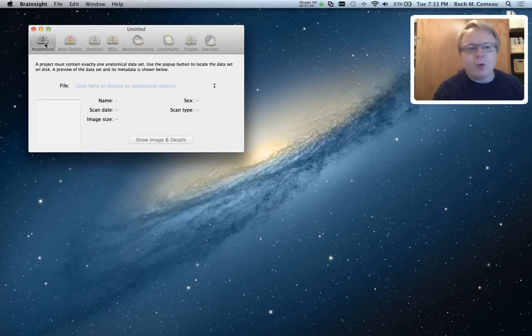Okay. Most of these steps are optional. It largely depends on how you will define your target, and we'll go over these in a few moments. The first step is called anatomical, and that is a compulsory step. In this step, you pick essentially your anatomical images.